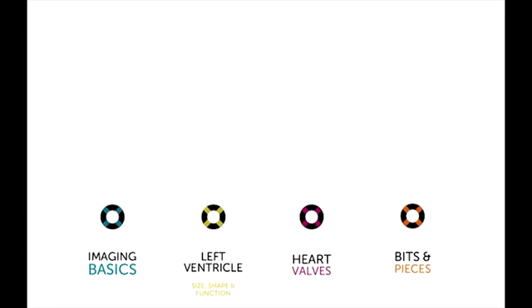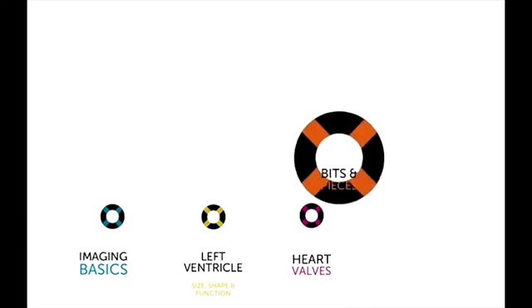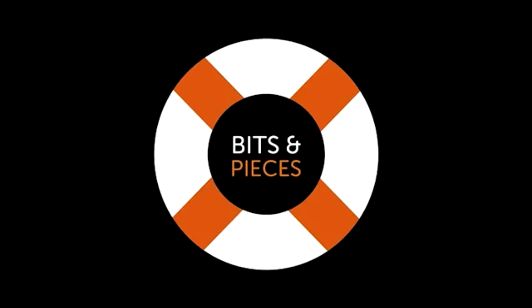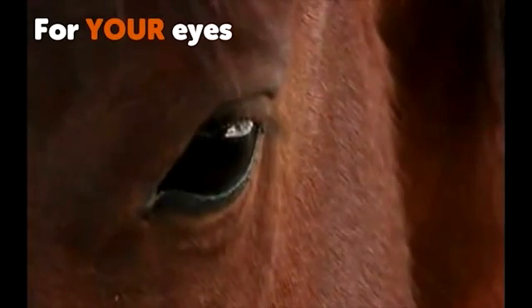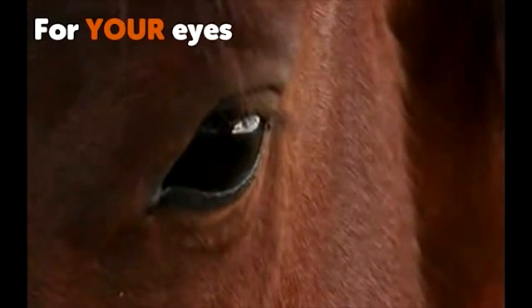The fourth and last part of this video tutorial is called Bits and Pieces. It will deal with topics that we have not covered yet. It will be a fairly easy and simple lecture because all you have to do is lay back and watch with your eyes graze to look at the beauty of echocardiographic images. Just as beautiful as this horse is.